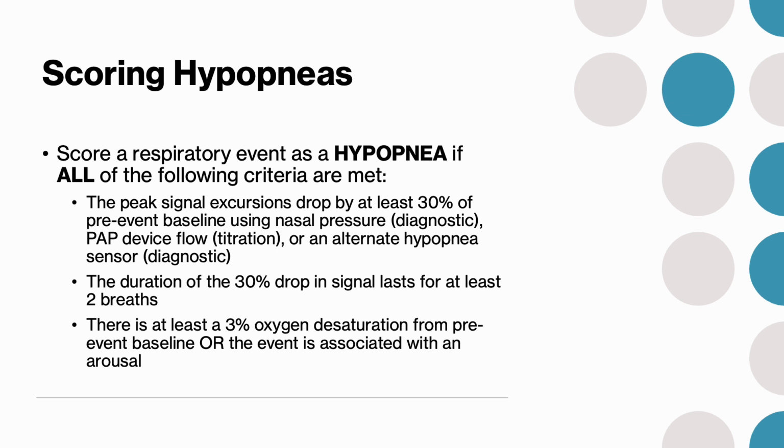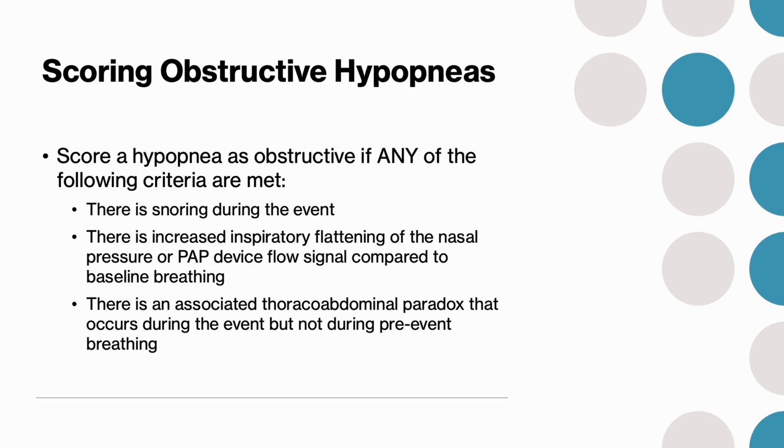And remember, it's harder to score hypopneas with a 4% desaturation than a 3%. A lot of patients just have 3%. Why would the AASM include 3% if they didn't think that was the minimum that we can allow, or the maximum that we can allow, instead of 4%?